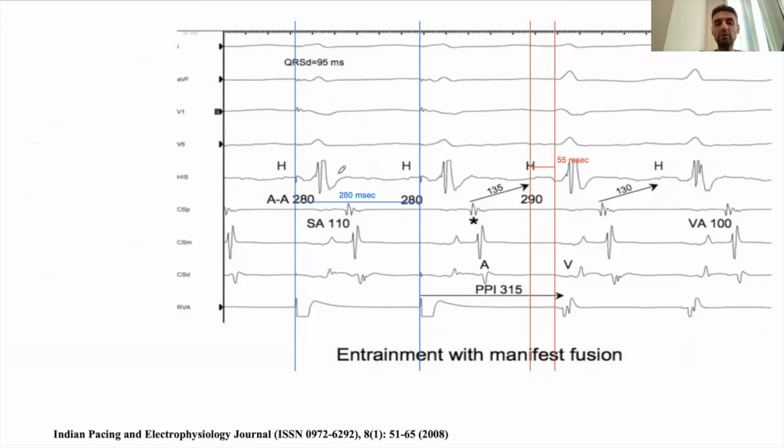Further examples. So here you are burst V-pacing at 280 milliseconds. You were able to accelerate the tachycardia, the A to A interval to the ventricular stimuli interval, and then after you stop pacing, the tachycardia resumes to its native cycle length. With ventricular pacing, you note narrow QRS, very similar to the tachycardia QRS, however, with subtle changes. So there is definitely evidence of fusion. So you're fusing and you are accelerating the A with similar atrial activation sequence. So you know there's entrainment with fusion.